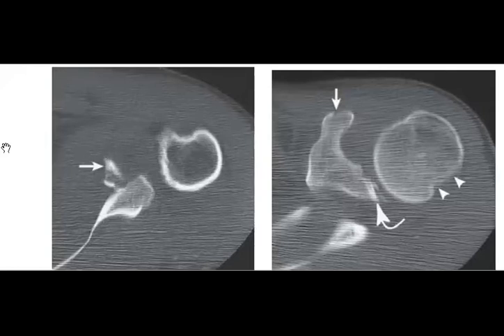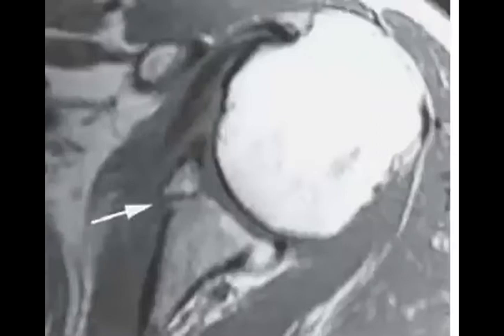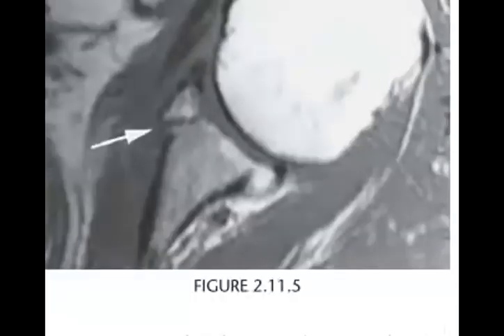When you see the Bankart lesion, you will expect Hill-Sachs, and when you see Hill-Sachs, you expect Bankart, right? And both of them have a reverse, right? So this one again, in the MRI, it will be the bony Bankart. Doctor, Marwa, Zuhair, perfect. Okay? It's an easy one.